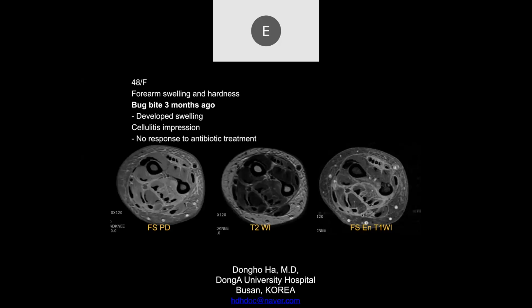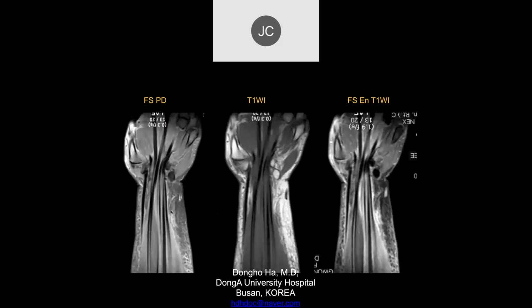Yeah, I'd be worried about infection given this bug bite. Certainly infection. It certainly looks like it's inflammatory, doesn't it? But we don't really see a lot of just fluid collection. Right. So usual infections that we get with cellulitis from bacteria, you'll often see fluid collections and little abscesses and so forth. But we see a lot of edema, and it seems like it's primarily thickening that's going on in the fascia surrounding the muscles, though there's some inside the muscles.